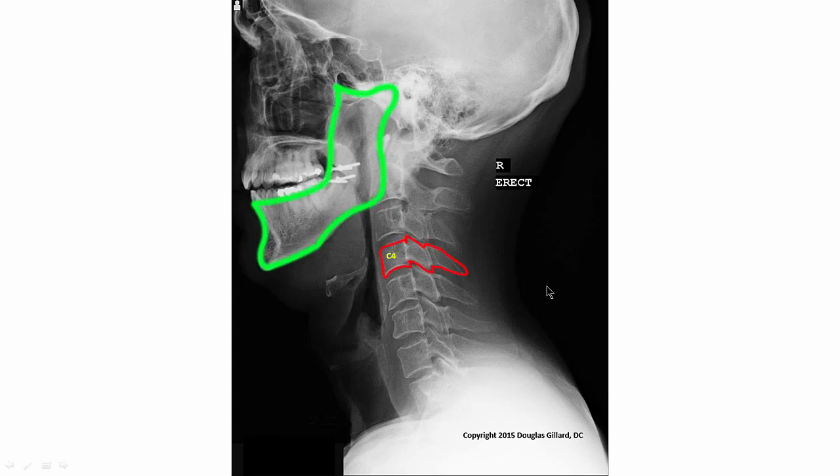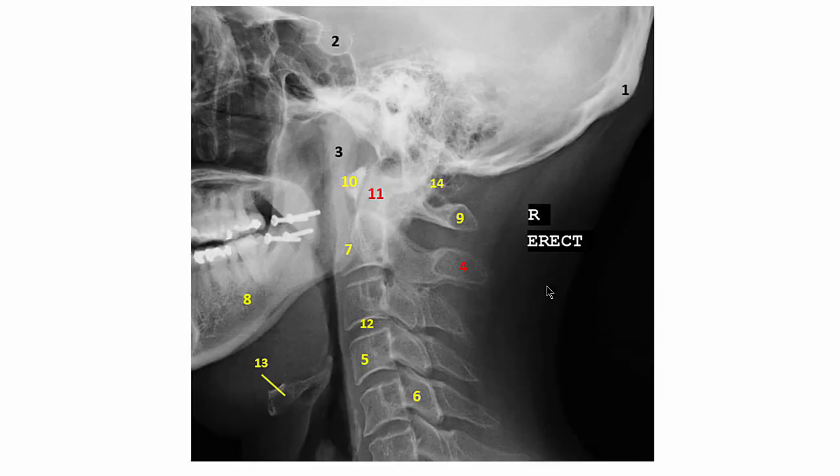Okay, just to help you if you're having trouble, you can go back and forth to help your eyes hallucinate this stuff in here. Okay, I think we went over all these already.